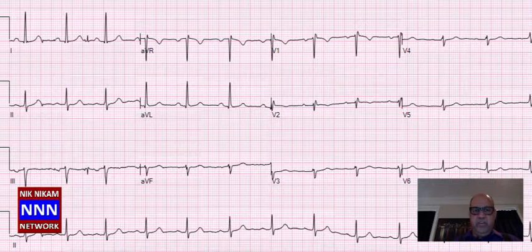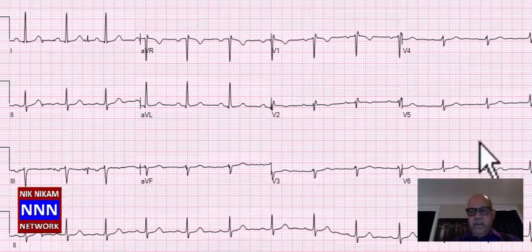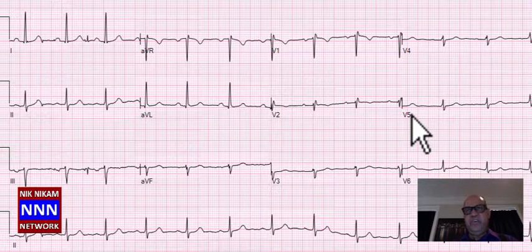So you wonder, does this patient have a pleural effusion, pericardial effusion, or localized something inside the chest that may be preventing the leads from showing the electrical activity? Is this related to misplacement? If this is a female patient, if you put this way up above the breast level in the second space, you're going to get negative deflections in the anterolateral leads. So these are all the things that should come to your mind. Then you go back and look at the patient, look at the chest x-ray, look at the echocardiogram, and see, does this electrocardiogram fit? Does this patient have an anterolateral infarct, or is it just related to lead placement?